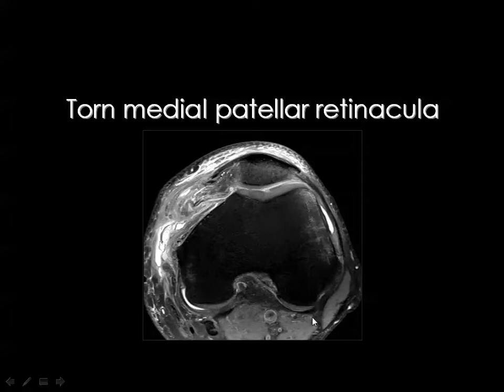And you know the tear of any ligament in the body, especially if the ligament is small, by two facts: that you cannot normally see the ligament at its anatomic site, and the anatomic site of the ligament is filled by fluid signal. These are the signs that you can count upon for diagnosis of acute ligamentous injury.